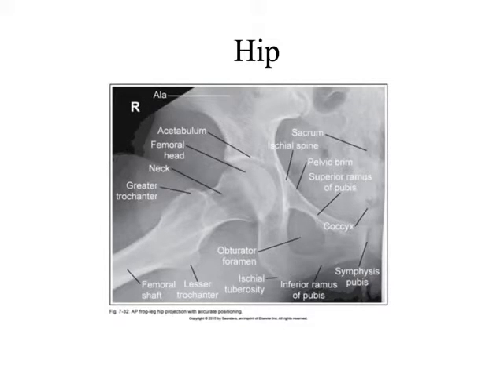What are we looking at here? What is this image? Yeah, frog leg lateral. What's another name we might call this? Let's see if I have it in here. Axial lateral. No, not axial. This is the Cleaves method. Cleaves method. Frog leg, lateral hip, or Cleaves method.